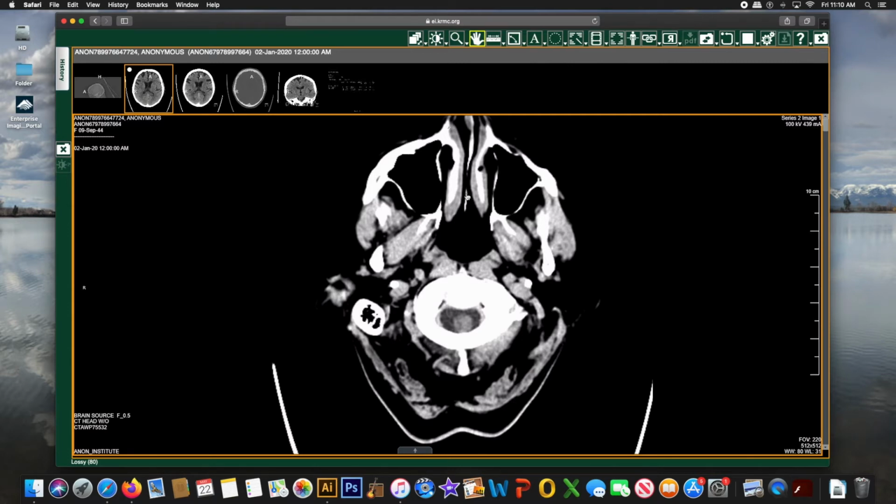The next icon on the toolbar is the measurement tool. It defaults to a simple point-to-point measure that can be achieved by clicking on one point and then left-clicking again at the other point. Your measurement will appear. To remove the measurement, simply right-click on it and it will disappear. There are several other measurement tools in the menu that you should familiarize yourself with.